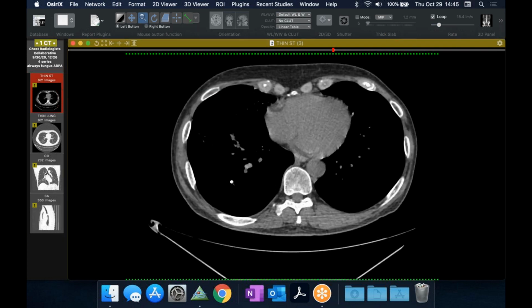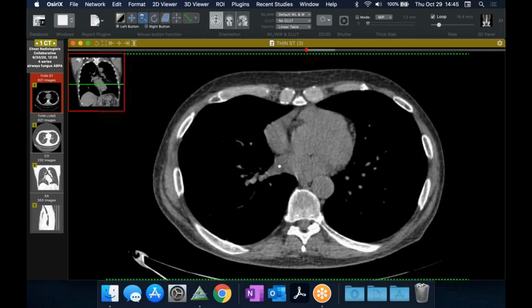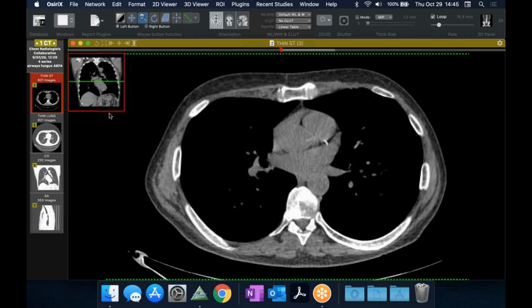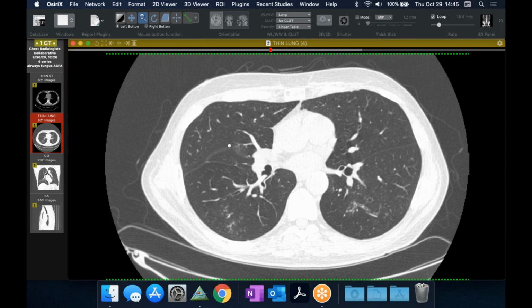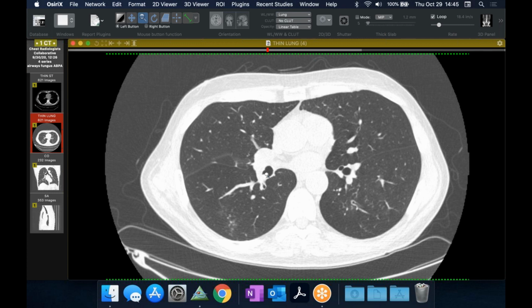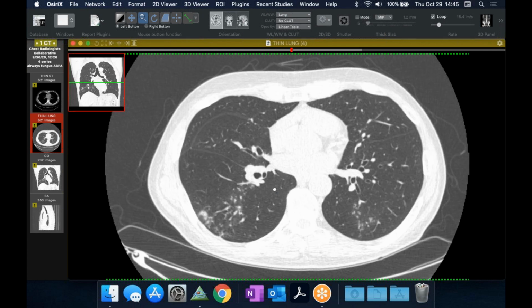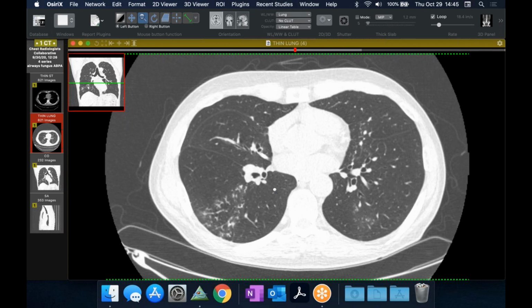Well, not really centrally. That was one of the thoughts, that the mass in the apex could be a tuberculoma, but there was nothing on the initial scan. There's nothing in the arteries on the initial scan or in the LV apex. And then about a week later, it's there. Strange, very strange. She didn't have a PFO from that massive PE throwing paradoxical emboli? I didn't see that. Well, at least not, maybe on echo, who knows?